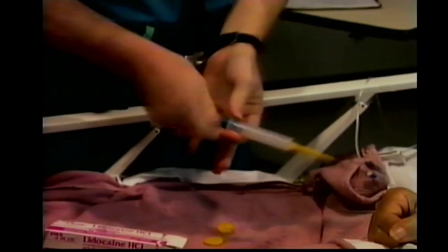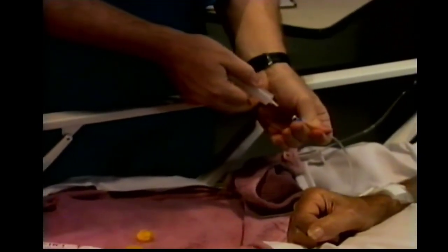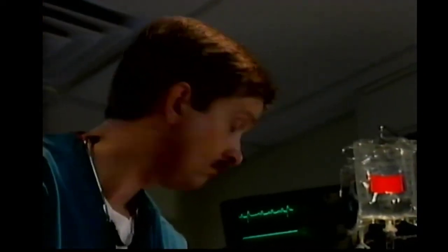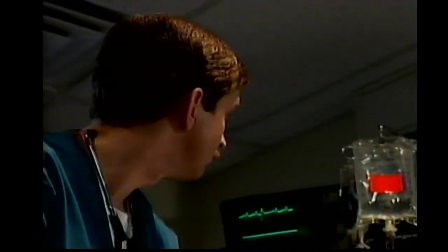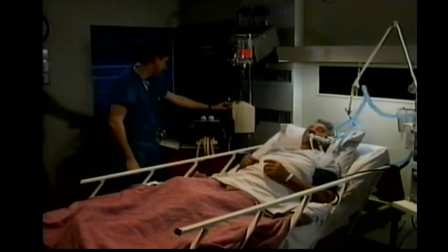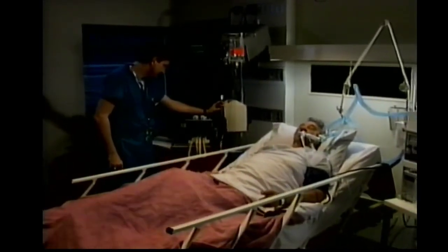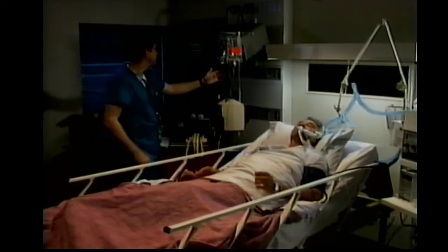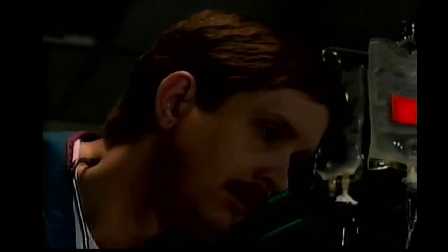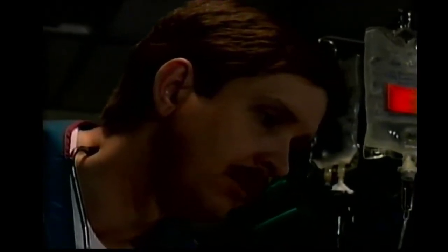It may be tolerated by the patient if it doesn't last long, but it usually produces severe hemodynamic instability. The presence or absence of left ventricular dysfunction and the ventricular rate seem to relate to the degree of hemodynamic compromise. Ventricular tachycardia arises from an ectopic focus distal to the bifurcation of the bundle of His. It may be sustained or it may stop spontaneously. When sustained, treatment must be immediate to prevent it from progressing to ventricular fibrillation.